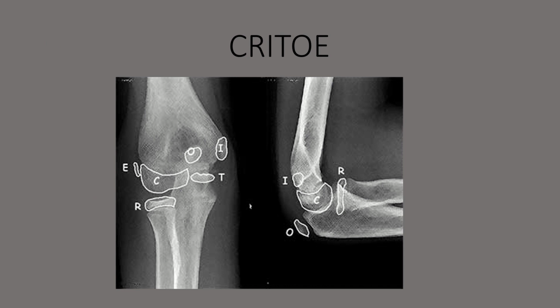This slide demonstrates frontal and lateral images of an elbow with the elbow ossification centers outlined.